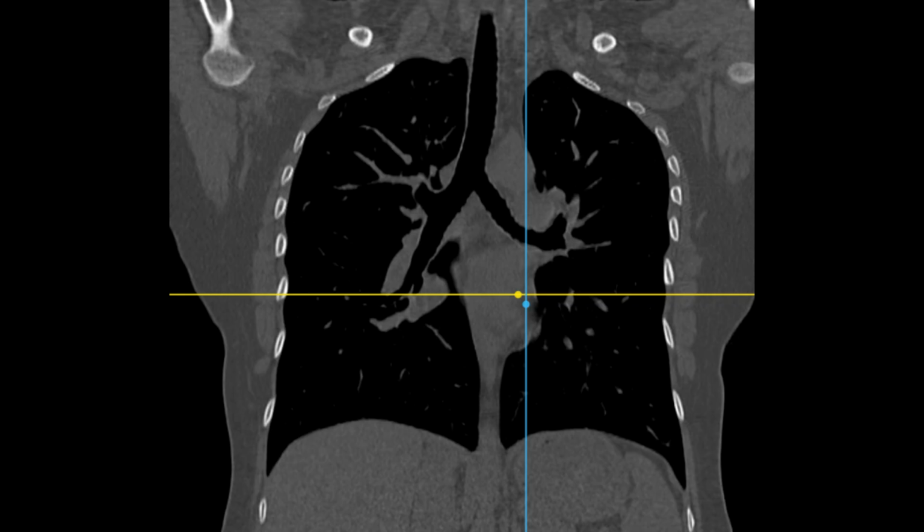No specific abnormalities can be conclusively identified from this single image alone. However, the overall symmetry of the lung field suggests a generally balanced expansion of both lungs. The airways appear patent, and no large masses, fluid collections, or significant areas of consolidation are apparent in this view.